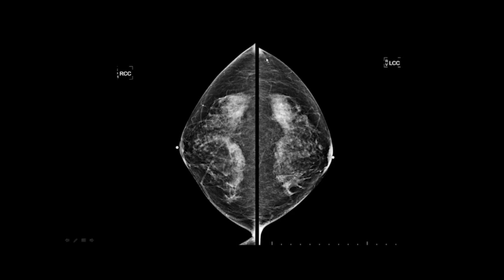Now in this patient, once again, you draw that imaginary horizontal line all the way across, and the nipple isn't perfectly centered, it's just millimeters medially here. But you could see, you could draw a circle here. It's very nice. There's a few tiny little skin folds, but that's not anything that's going to give you a deficiency. But the end of the parenchymal pattern on both sides are in the images. It's absolutely beautiful. There's retroglandular fat here, which is very nice. Good medial tissue, good lateral tissue.